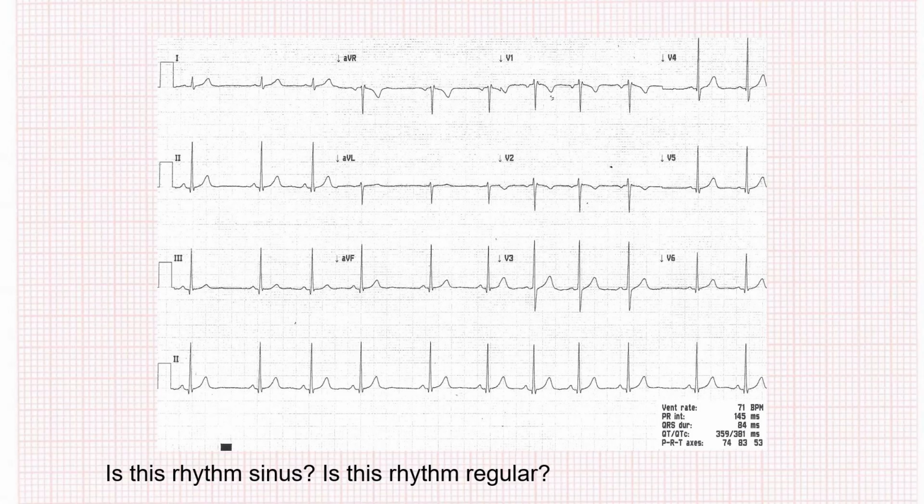So this set of beats all look sinus, but then you'll see irregularity created where there's a delay. And then there's a QRS segment, and then there's that same P to R interval and that same couple of beats, which all look sinus, and then followed by a delay. So this is just an example of what is a sinus arrhythmia. Sinus beats are happening, but there's an irregularity to it, but the irregularity is happening in the same pattern.